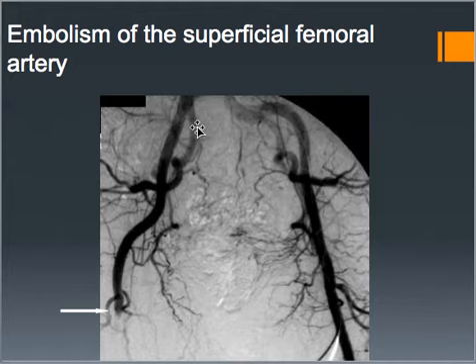These are the femoral arteries. So right here on the right femoral artery, you've got an embolism. So the blood flow's just stopped right here. See how it continues to go on this one, and it just suddenly stops right here on this side.